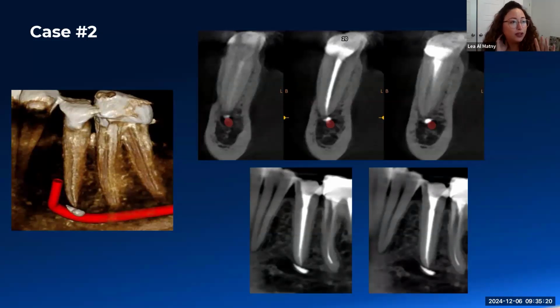Whereas in other cases, you will see the mandibular canal in contact with the apices of the mandibular molars, specifically first and second molars, usually more common than the premolar. There is no rule of thumb that if the patient looks like this, then it's lower, and if the patient looks like that, then it is in close proximity. We would have to take a scan and see where the mandibular canal is.